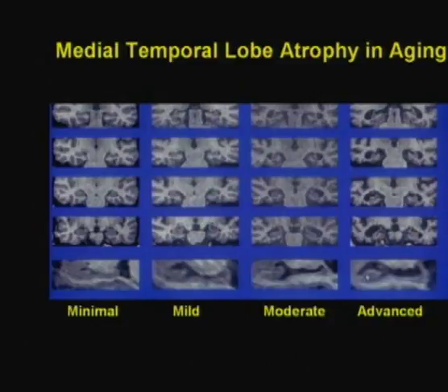If you look at a sagittal plane, you can see the gray matter of the hippocampus. You can see that claw-like structure that I described to you. Nestled in between is the head of the hippocampus. Now, why don't we use the sagittal? Well, the problem, of course, is the partial volume effects of slicing an elongated structure in the sagittal plane. So you're never quite sure, am I in the hippocampus itself, or I'm just looking at partial volume effects? So look at what happens to the transverse fissure. It becomes quite enlarged. And then this communicates with the retropulvinar cistern. This same fissure goes to the back of the thalamus.